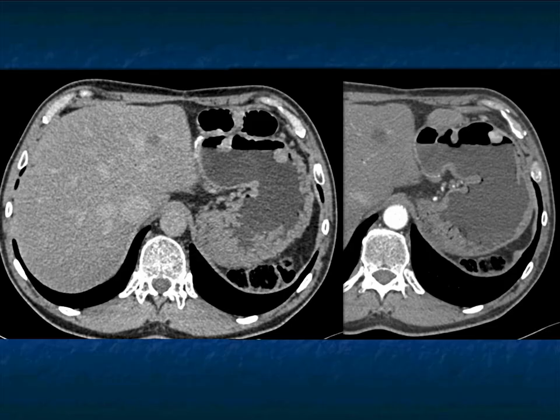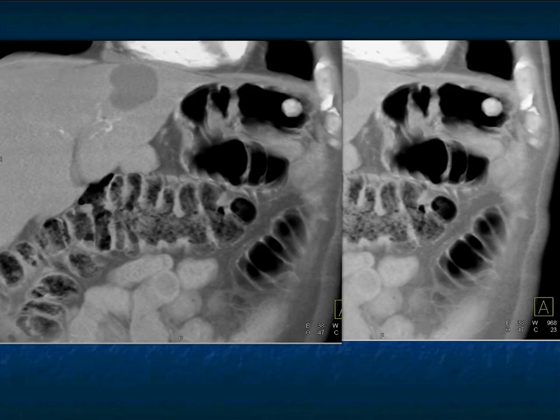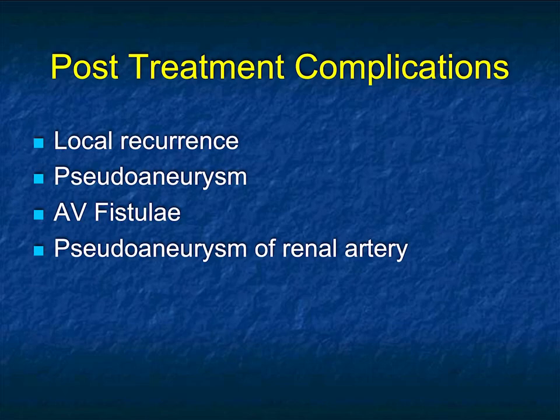But in every patient, water is a great oral contrast agent. Use it and take a good look at the patient's stomach. And here it is with just some volume rendering, almost making the images look like a virtual colonoscopy. Now, everything I've spoken about or showed you for the most part have been patients with total or partial nephrectomies.